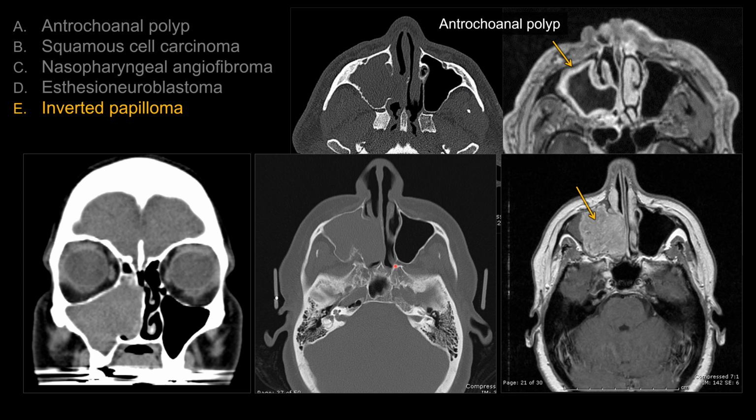The lesion occurs at the sphenopalatine foramen, subsequently expanding the pterygopalatine fossa. So the classic presentation on board exam, they should show you a lesion that's very vascular, often with local bony destruction. More importantly, it shows you asymmetric expansion of the pterygopalatine fossa, and that's not the case here.